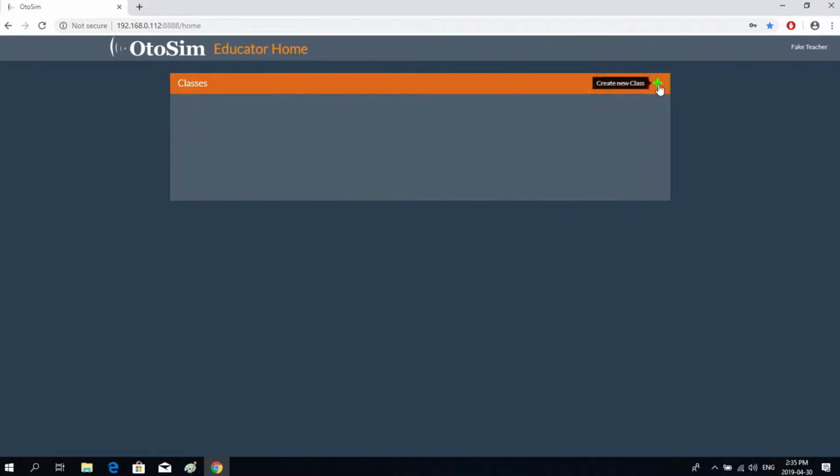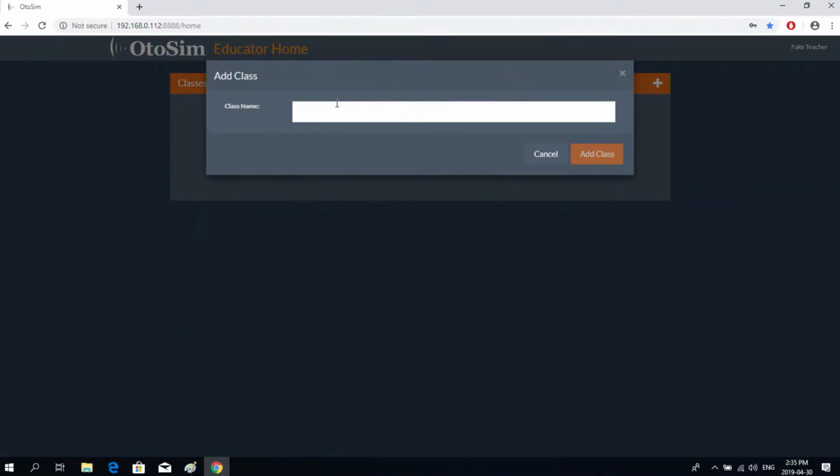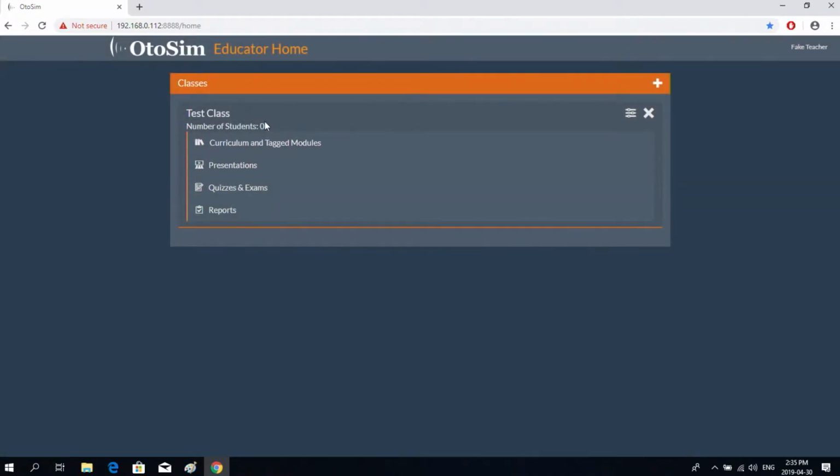I want to create a new class, so this is where I create my class. So I click on here, and then I can add my class. So I want to call my class, let's call it test class. Okay, I add my class. Now this appears. So the name of my class, test class, the number of students that are in my class, there's no students in my class yet.